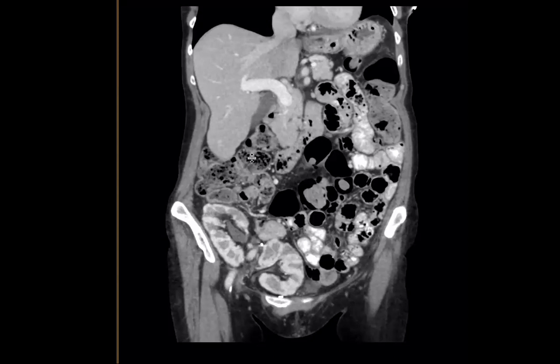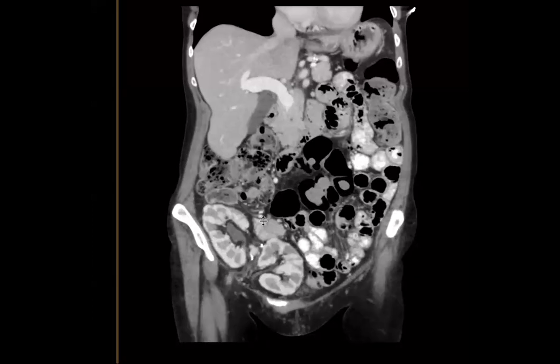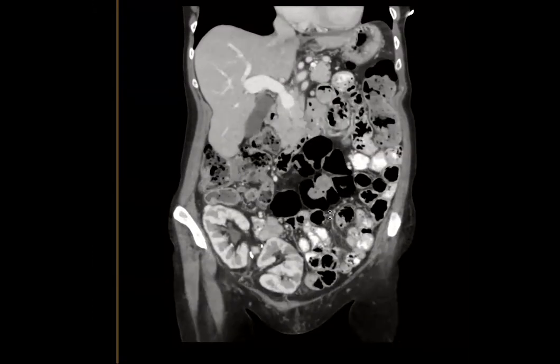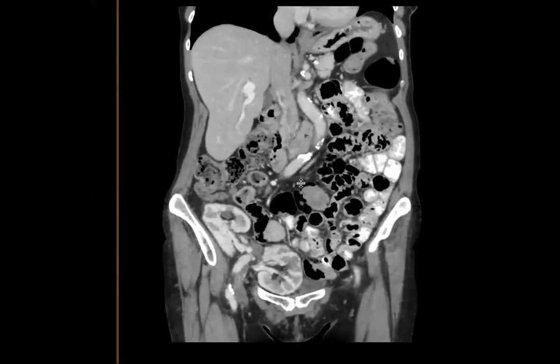But if the child, unfortunately, is less than 24 months, then they usually tend to harvest both pediatric kidneys and place them, particularly when they want to donate to an adult patient. So that is the story here. These are pediatric kidneys. They were simultaneously transplanted into the right lower quadrant, and they're working just fine.